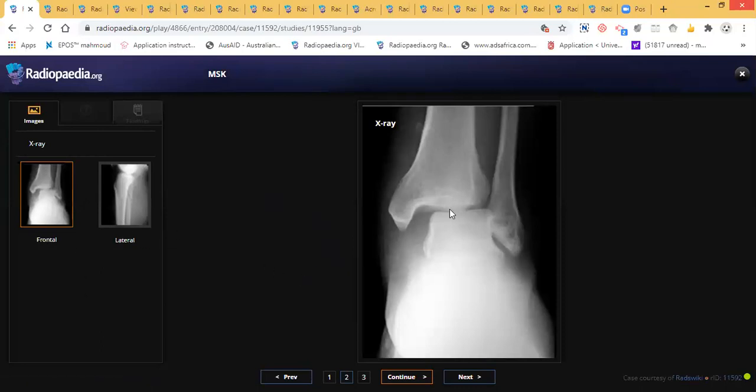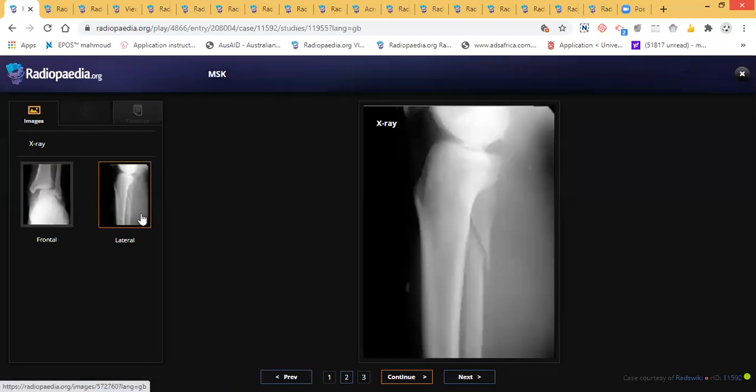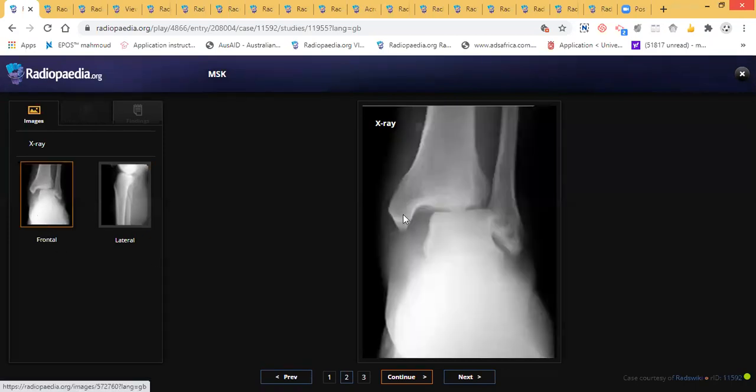But when I show just this, when you find this widened tibiofibular joint, then you can say that it is a Maisonneuve fracture. Someone, he's French. So what could this fracture be? You should check the proximal fibula, because they are associated by the mechanism of injury.